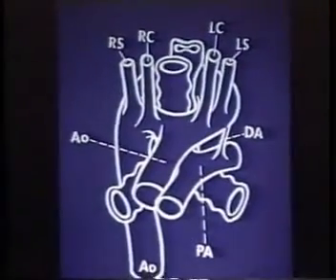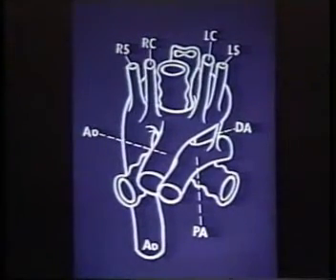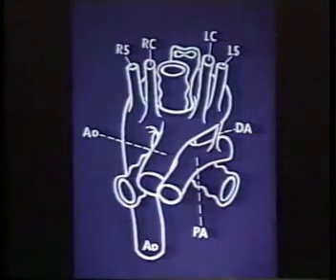As described by Eric, our patients are scheduled electively, sedated if necessary in the manner outlined. I do a localizing sequence and then do cardiac-gated multi-section spin echo imaging in the coronal and axial planes, usually as 2 separate sequences of interleaved images at 3 or 5 millimeter intervals.